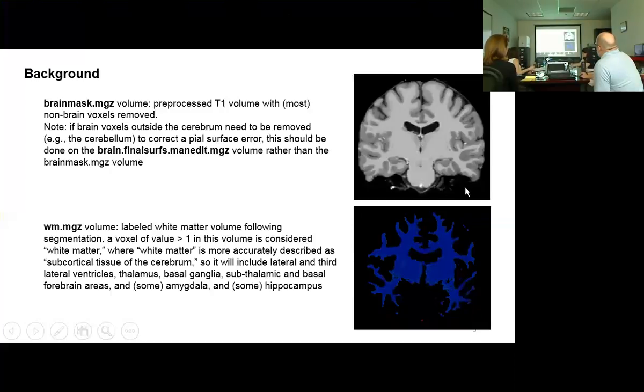When this scan is fairly high quality, often the processing steps that come downstream from this are able to understand that this is outside the brain, and it will make a surface that does not include these things in it. The other thing that it does here, which is key for those of us that want to try to figure out ways to improve the core scans, is it tries to do a normalization step on the white matter.